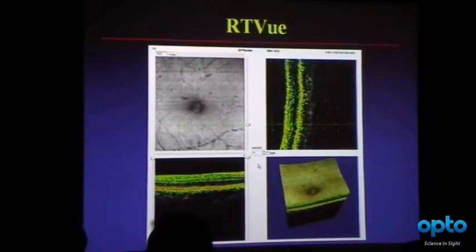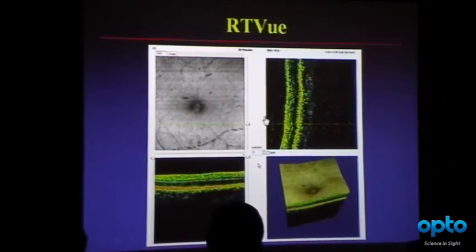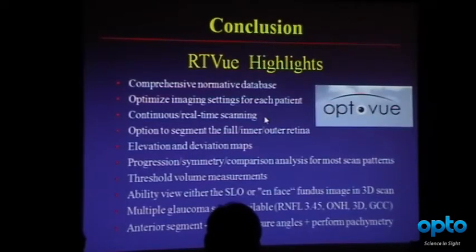I think you may have to take my word for it. There was no break. Take my word for it. Now, this last case, obviously a case of idiopathic juxtafoveal telangiectasias, and an interesting three-dimensional scan as you scan through it. So, let me conclude.